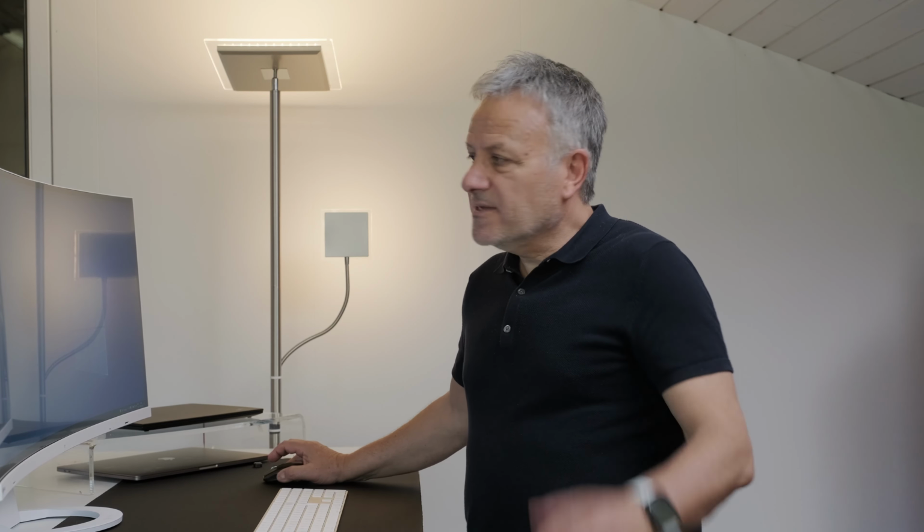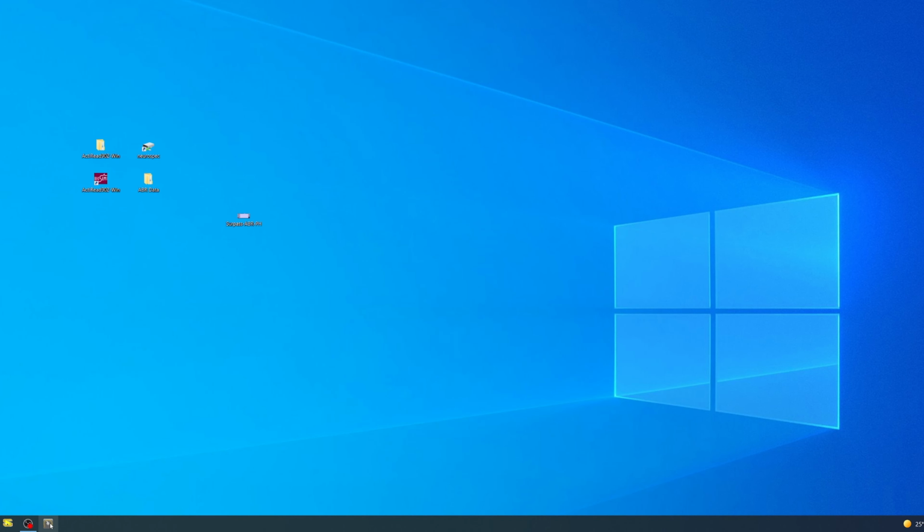So there you go. Let's head over now to BESA to see what that file looks like when we open BESA. All right, we're back. Let's open BESA.